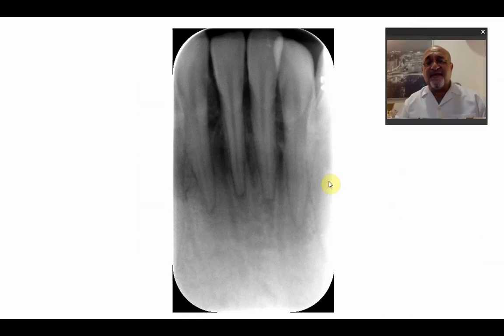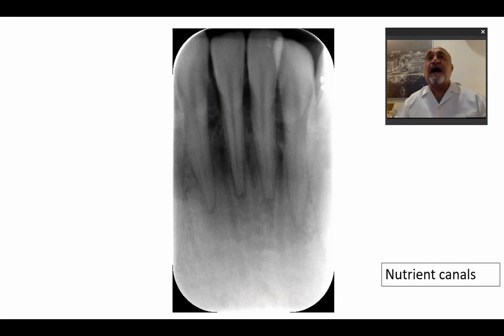Have a closer look at this radiograph. You will see that there are longitudinal lines that run from almost the alveolar crest, if it shows, downwards almost to the lower border of the mandible. You usually see these lines in patients who are hypertensive, or in obese patients. These are nutrient lines. These are passages of blood vessels from the alveolar crest downwards.